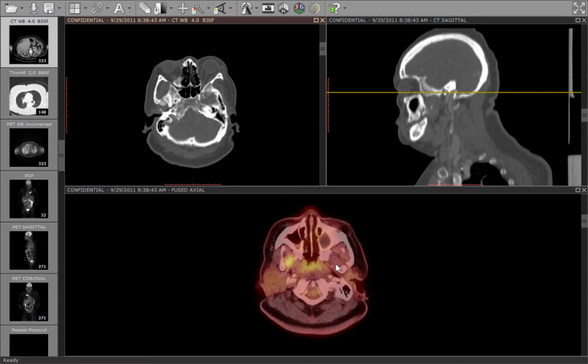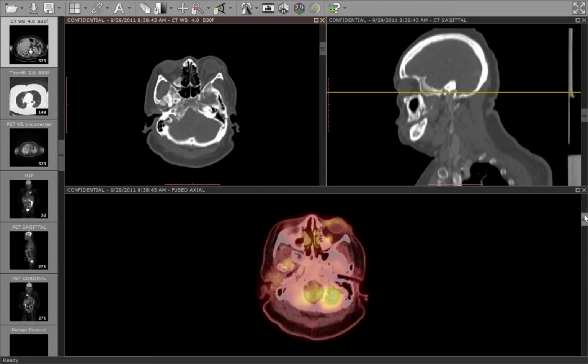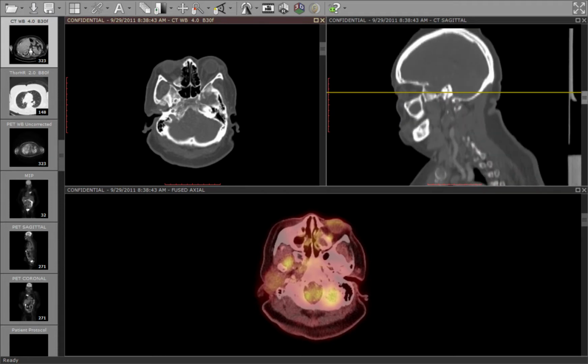So on the left side you have the lateral pterygoid muscle that attaches to the lateral aspect of the lateral pterygoid plate and attaches to the condyle. And then take a look at the one on the right. It's got a bunch of activity in it. So for some reason, the patient's right lateral pterygoid is very active. It could be in spasm or just be hyperactive. But you can see all the glucose molecules that were attached to the radioactive fluoride went to that lateral pterygoid muscle. And that corresponds to the anterior subluxation on CT.